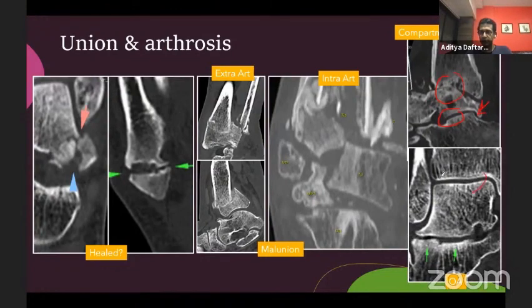Similarly, here you can see the tibiotalar joint is pretty good, but the subtalar joint is irregular in this patient who's post-calcaneal fracture. So it gives you a sense for which joints are involved with osteoarthritis and therefore what kind of fusion you may have to go in for.